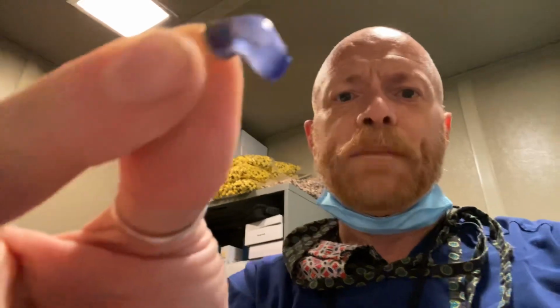They have ones that go deeper into the ear. This might be what's called a completely in the canal hearing aid. Everybody wants these. Everybody wants hearing aids that are invisible, but will insurance always pay for those? This is a super tiny CIC. Look at how tiny this one is. Most patients, if they had their druthers, would get something this small.